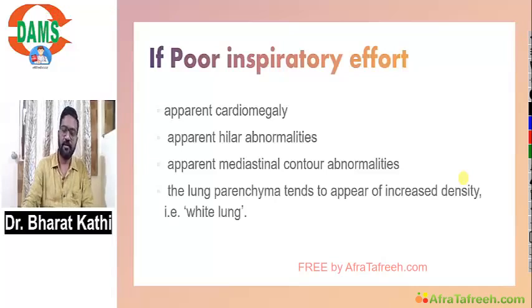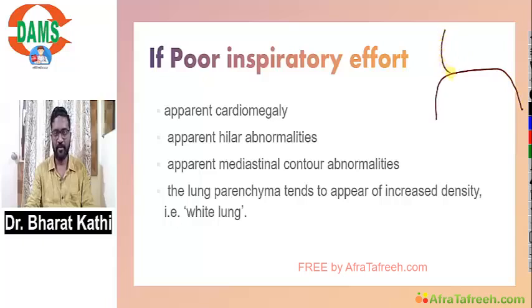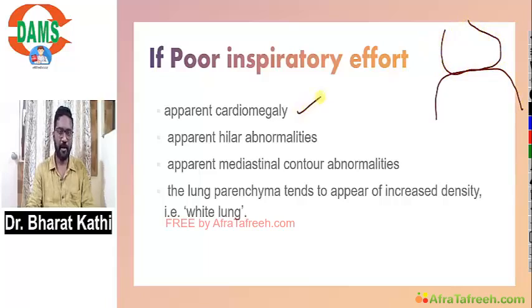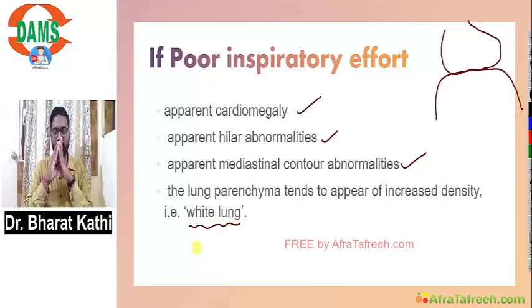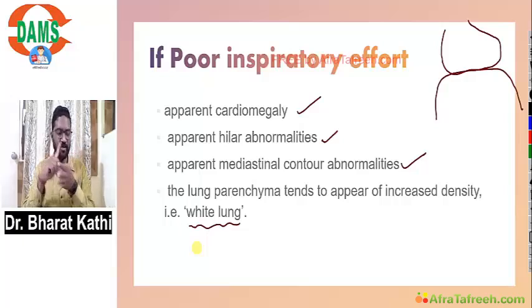Now if there is poor inspiratory effort, because the lung has not expanded properly, the diaphragm must have come up. Because of that, the heart will occupy a bigger shape. There can be apparent cardiomegaly, apparent hilar abnormalities, apparent mediastinal contour, and because the lung has not expanded properly, it might appear more white. So very simple, if it is a poor inspiratory fill, you cannot comment on anything. You cannot comment on the mediastinum. You cannot comment on the heart. You cannot comment on the lung. You cannot comment on the hilum.